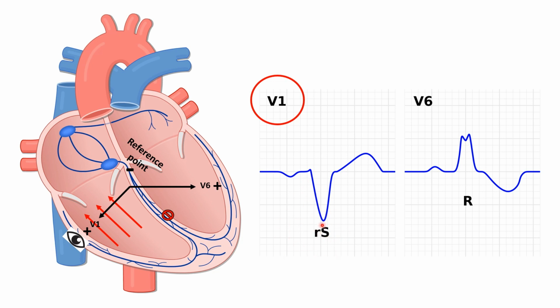But we have some septal branches, so the cardiac conduction system is very interconnected. So we still have some septal branches which allow depolarization of the left side of the heart. So from right to left, we can eventually have some depolarization of this left side of the heart, but it is delayed. And the result is typically a wide monophasic R wave in V6. And if we look at the diagram here, we can see that it is M-shaped, okay? But it can also be monophasic, so it could also just go up like this and curve at the top rather than have this M shape. Okay.